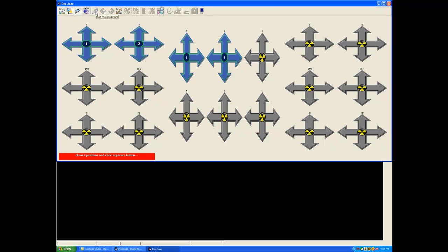sequence, and by going up to this button, this little icon of a tube head where it says Start Stop Exposure, by clicking on that I enter the exposure mode. I'm now getting a sign here which says ready to take X-ray. I'm counting down from 900 seconds, which is 15 minutes, which I have to do this one shot. Normally much more time than needed.